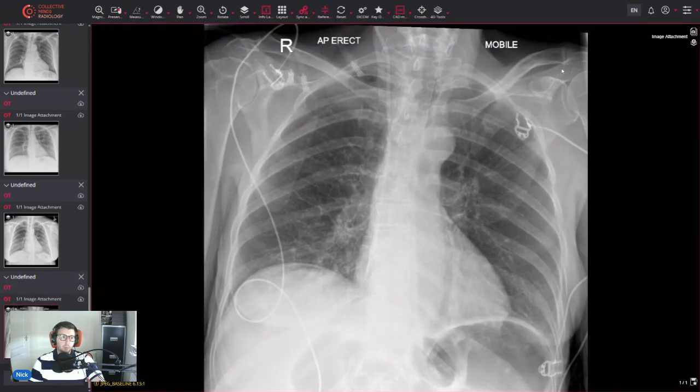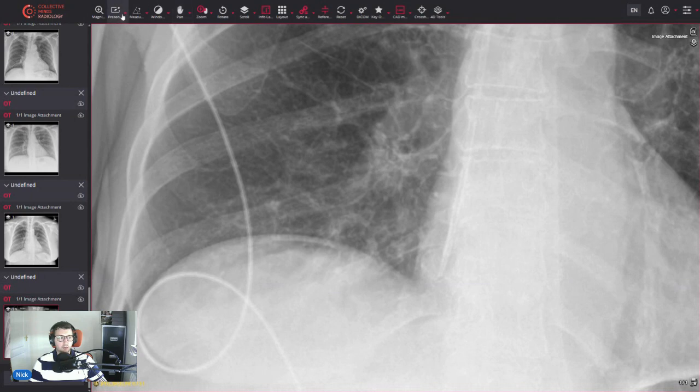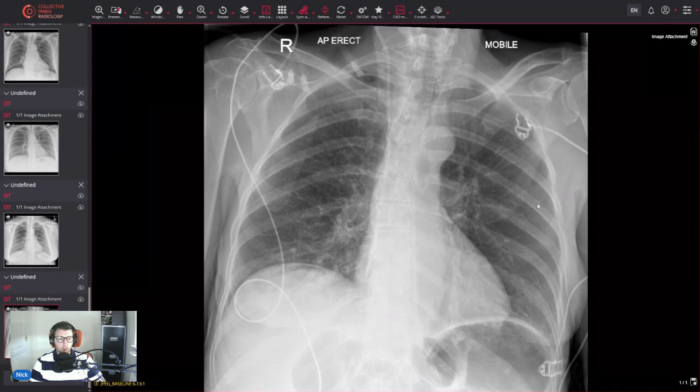And finally, we've got a patient done AP erect portable. First thing to note before anything else is we've got some free gas here below the right hemidiaphragm. We've just got a sliver of it there of lucency. This is a patient that presented following laparotomy. So this has occurred due to opening the patient up rather than a perforation. We've got just normal stomach gas here on this left-hand side.